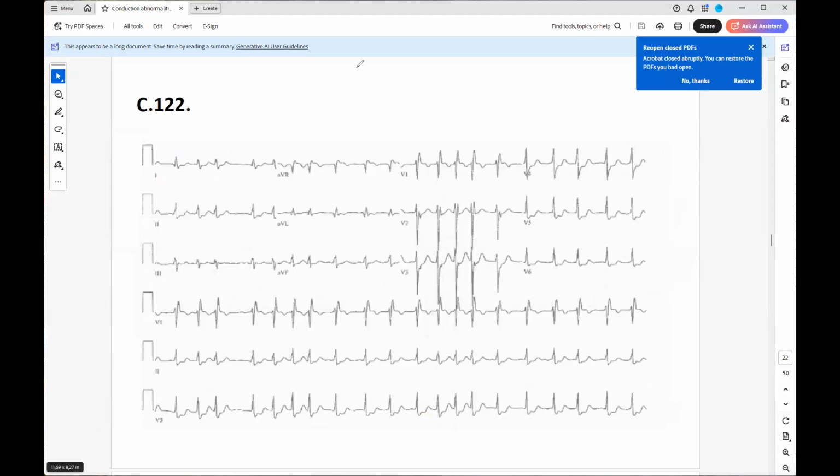Could you tell me the answer, please? Arrhythmia, no P wave. This is atrial fibrillation, okay? Atrial fibrillation. Do not forget it. Because if we do not have P waves and we do have rhythmicity, we have to assume that we do have an escape rhythm, such as a nodal one or a ventricular one.